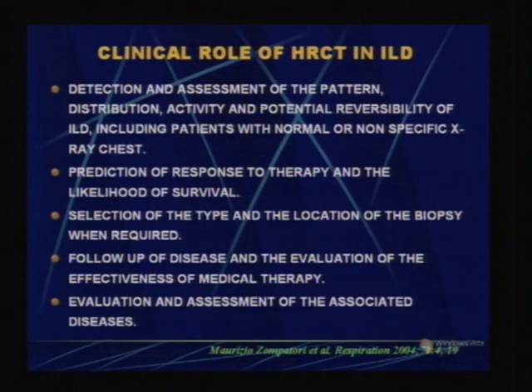We can very nicely define the secondary pulmonary lobules. We can look into the interlobular septa. We can look for the distribution of the disease. We can look for the involvement of the central area. We can look for a specific involvement of the lobule, whether it is a panlobular involvement, a paraseptal involvement, or a centrilobular involvement. We can also get some idea about the activity of the disease, and we can also look for the response to therapy in these cases.